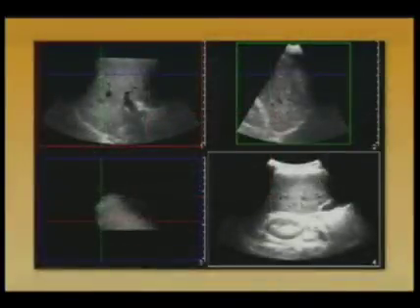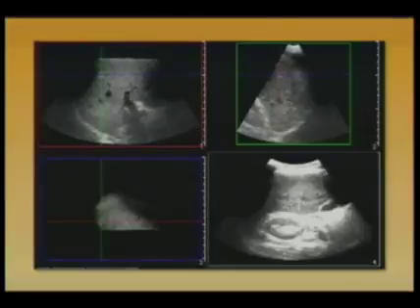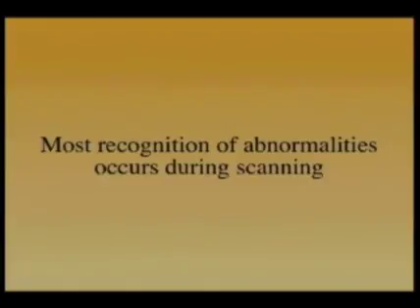And here is a multiplanar display of the same lesion. You can actually see I've intersected all 3 planes, so the point of intersection in each image, where the lines cross, is where the hemangioma is. Quite honestly, by just taking that 3D volume and slicing it, I don't know that I would have found it, whereas it was very readily apparent if you did a 2D clip through that area. So that's one area of concern.